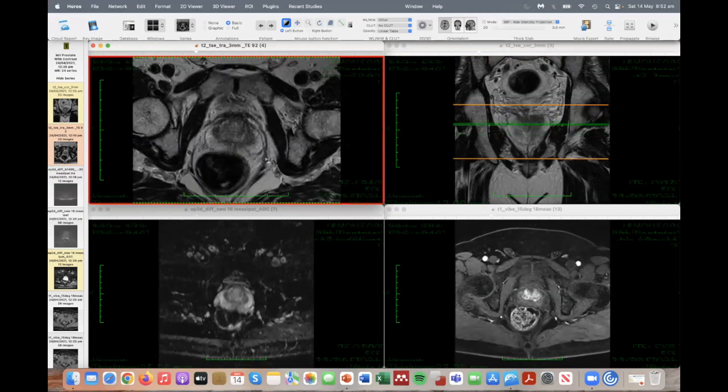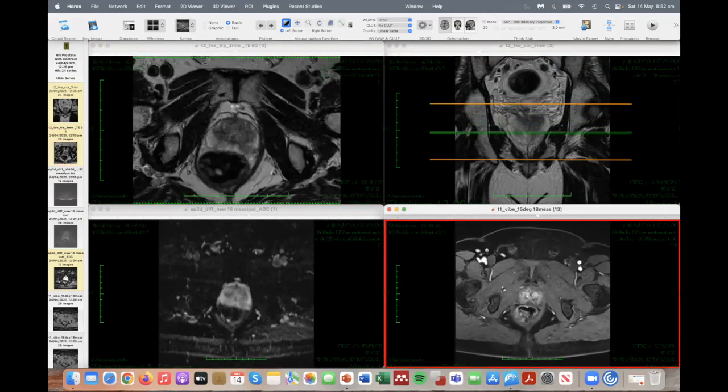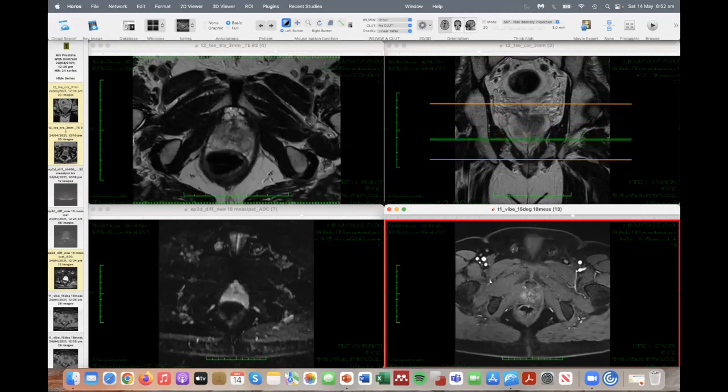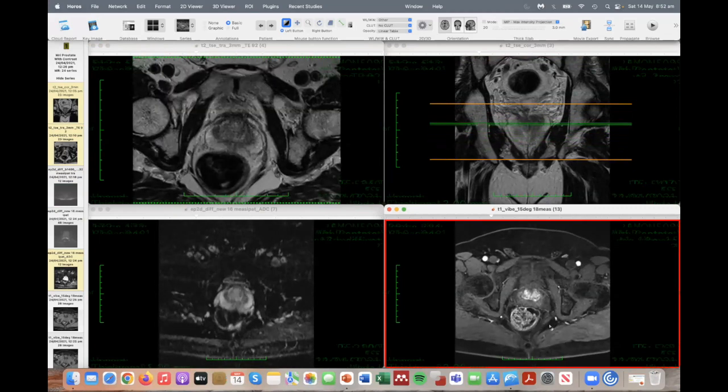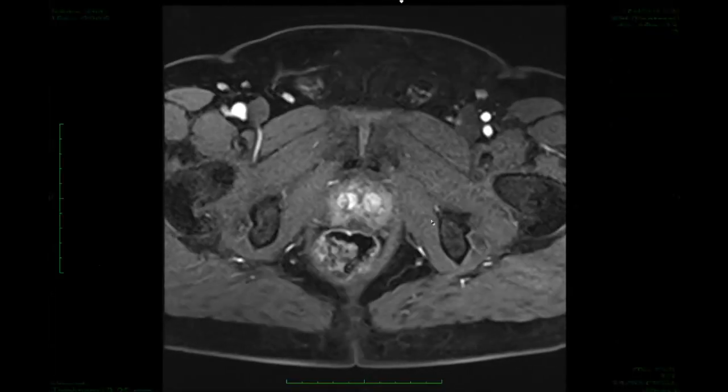So actually here, T2 weighted imaging and diffusion weighted imaging are not of adequate diagnostic quality, although there is a great sequence, which is DCE. You can clearly see the vessels in the Alcock's canal. You can clearly see the capsular vessels here. So the best sequence for this study is DCE.